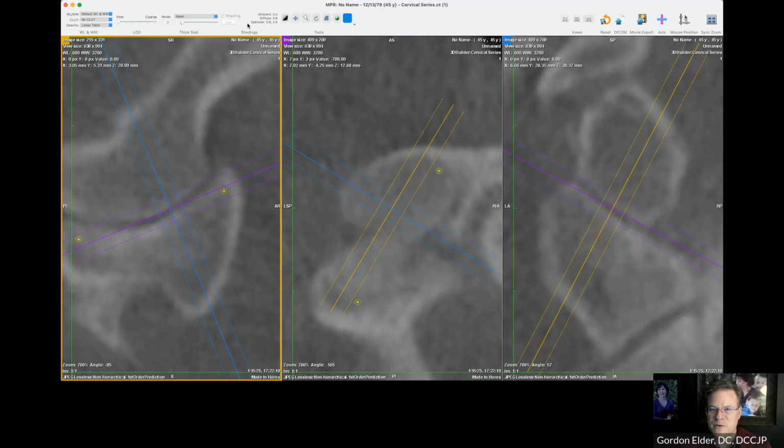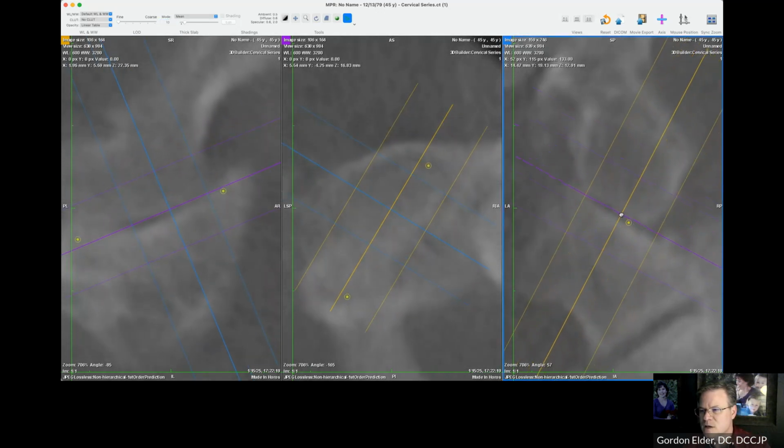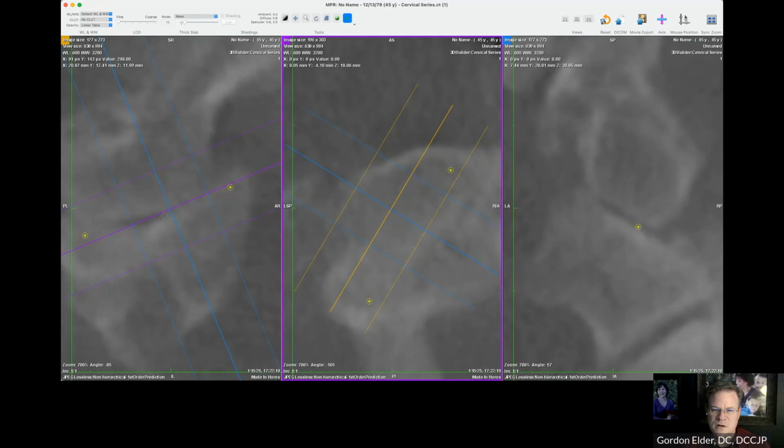Now I'm still at the 5, so I'm going to go back out, or I'm at 3. I'm going to go back out to 10. Seems like a good place to start in most cases. Make sure that my center lines are lined up. We're still looking good here. You can see this outside edge is here. We're looking pretty parallel to that line there. Let's just make sure that we're still looking straight down the joint there.